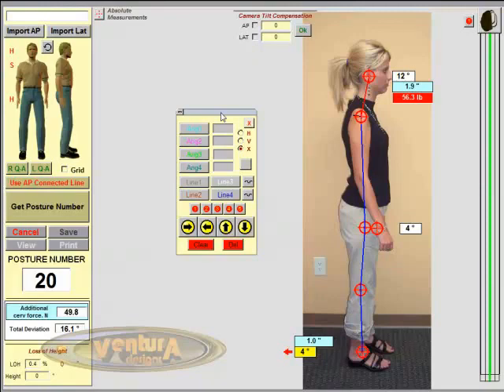Okay, we'll move forward from this screen, and we'll show you how to do the front-facing analysis or the A to P analysis in just a second. But I wanted to leave this screen and go to what we call the stress screen, and that's accessed by pressing the View button over on the left-hand side where the control buttons are.